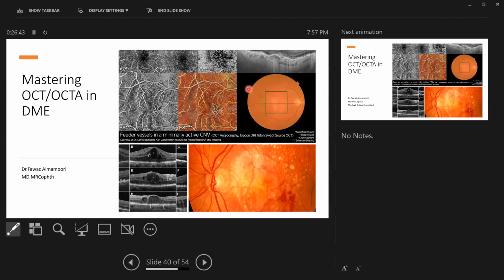Yeah, very good question. One of the questions is whether we can use fluorescein angiography in cases of RPE detachment. Now, in most cases, using fluorescein will not be helpful, because what we can see in the RPE detachment is just an area of hyperfluorescence, which is a progressive increase in intensity, not a change in the shape and the size, which is because of the pooling of the dye below the area of the detached retinal pigment epithelium. So sometimes the fluorescein may be helpful, but in some cases not helpful.